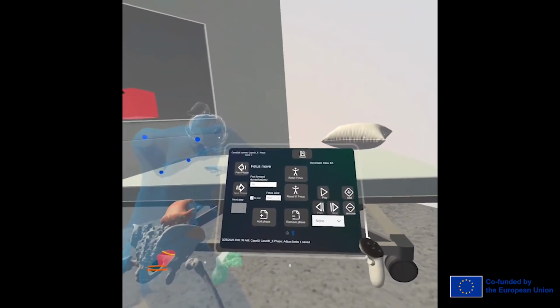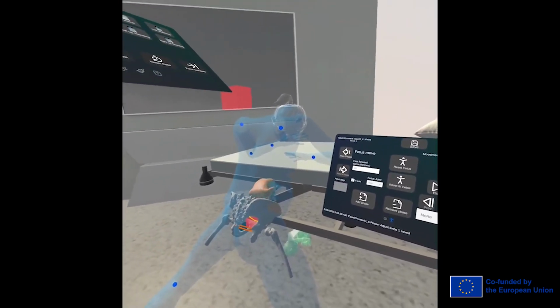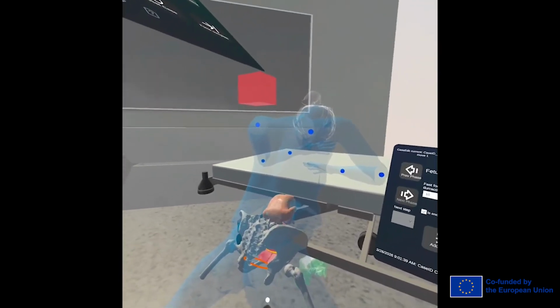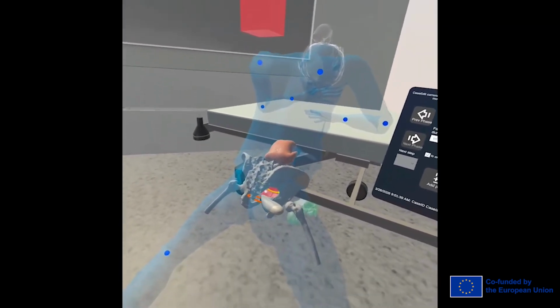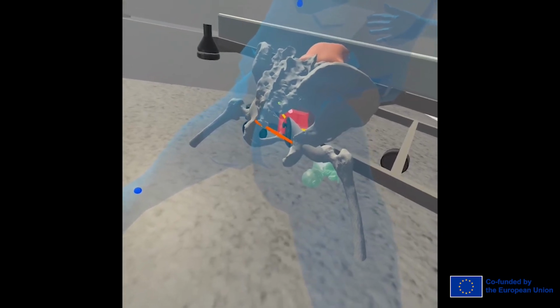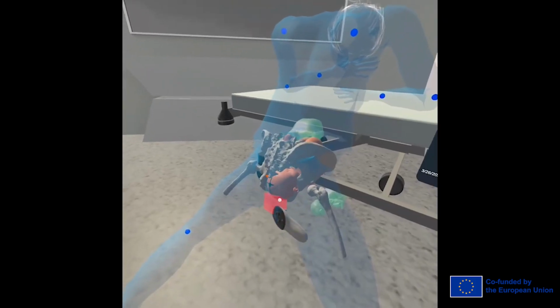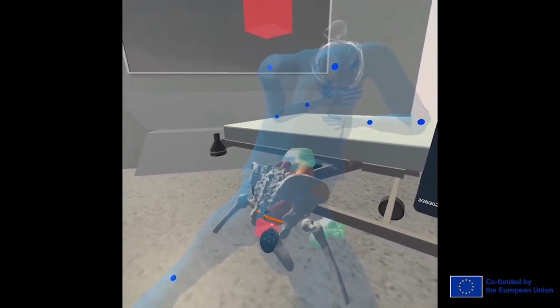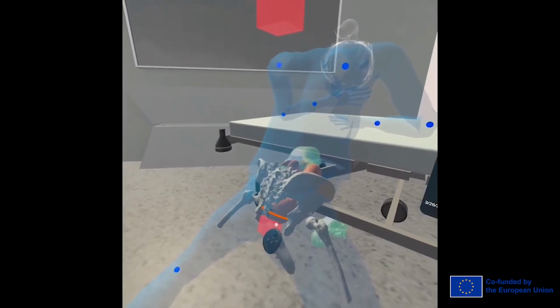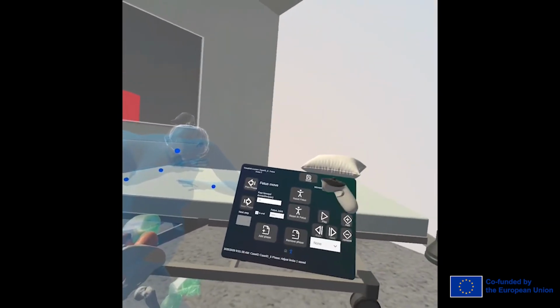Okay, in this last phase, you can set the movement of the fetus. So now you can see the fetus is sort of flickering because that is also showing the base position. Again, you will be grabbing the red square and adjusting the baby into the position which you would like. I'll just keep it like this. Perfect. I'll hit save.